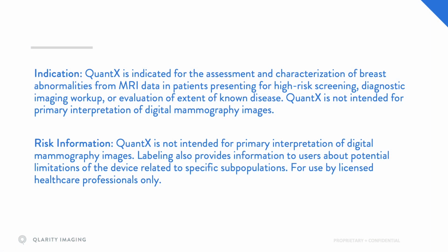Indication. QuantX is indicated for the assessment and characterization of breast abnormalities from MRI data in patients presenting for high-risk screening, diagnostic imaging workup, or evaluation of extent of known disease. QuantX is not intended for primary interpretation of digital mammography images.